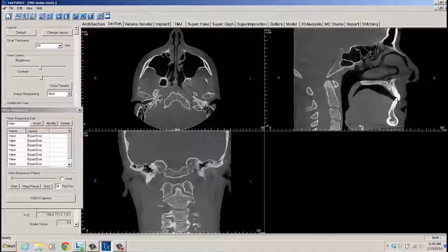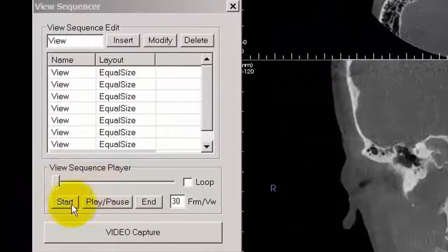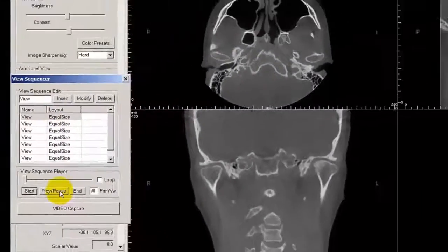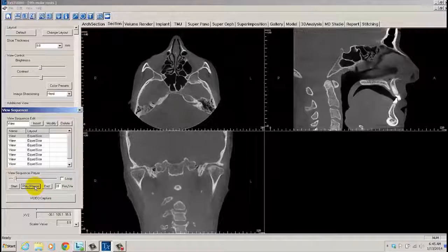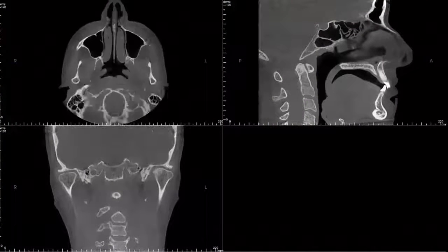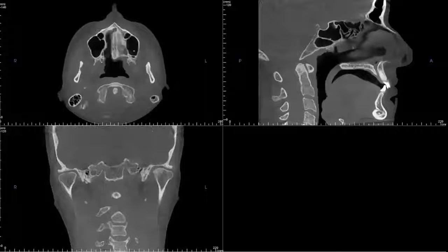You should have the mechanics of frame insertion now. Let's go ahead and check our work. We'll click on Start to go to the first frame, and then we're going to click Play. So between each of the frames that have been inserted, we have transitions are made where it's going through additional frames.